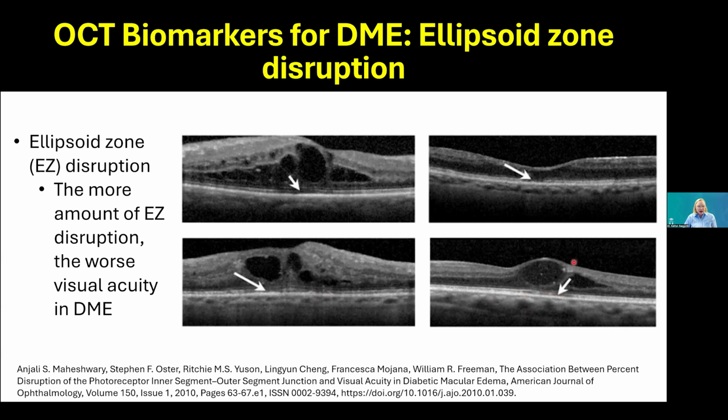And so again, you're really not going to know the status of their retina until they go through treatment, but there's sort of a thought that if there's chronic edema or very severe edema, and maybe it sits there, they don't get treated right away, they don't come in, maybe there's going to be more likelihood for more permanent damage to the retinal layers, which could be that you see ellipsoid zone disruption after they've been treated and they still have poor visual acuity, or maybe they have DRIL. So just a little more insight into your patients with using structural OCT.